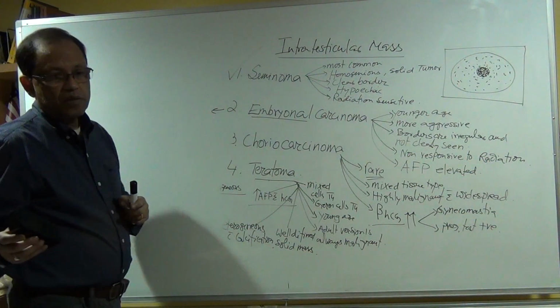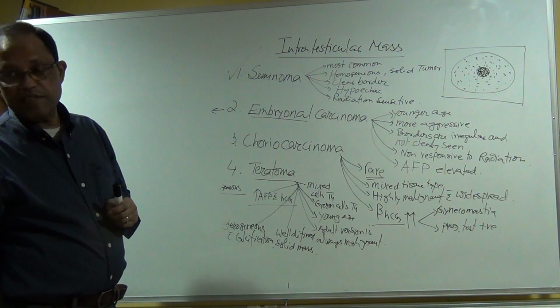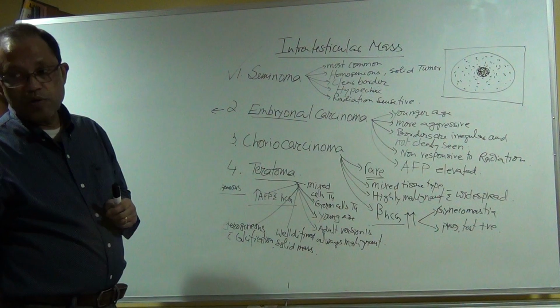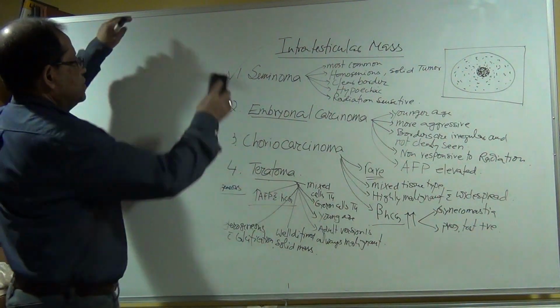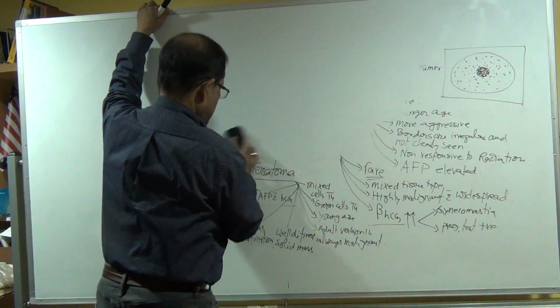One thing that is called testicular calcifications, called microlith, or you might get one picture like that.